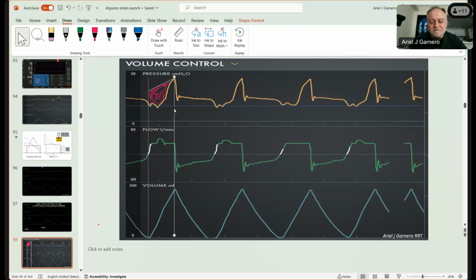Well, getting back to it, we're focusing on the PVI in the cycle phase. So if we agree that this is late cycling, and if the goal was comfort, then you would have to allow the patient to cycle inspiration. And the only way to do that would be to do something like pressure support or NAVA or PAV or volume support, something along those lines. So if you say the goal is comfort for this patient right now, then I would have to agree that this is probably late cycling. And if you wanted to fix that, you have to let the patient cycle by changing the mode.